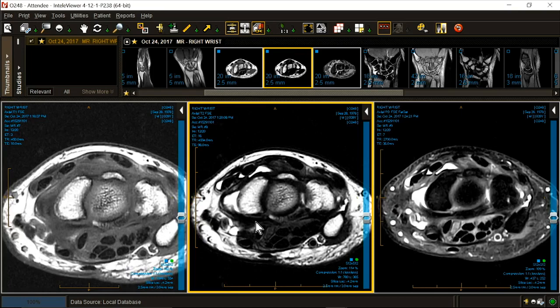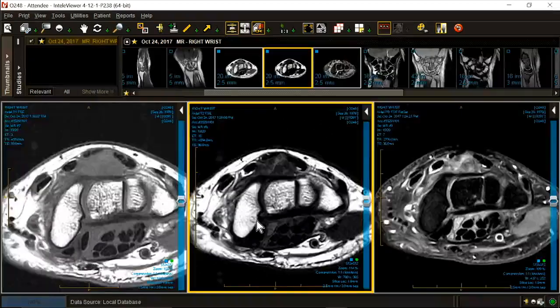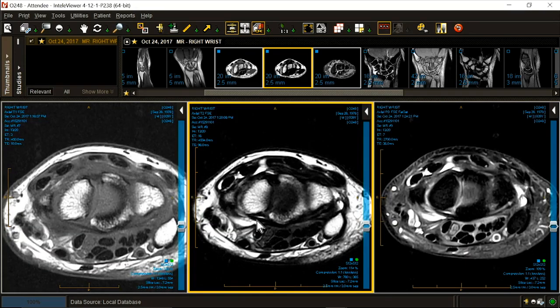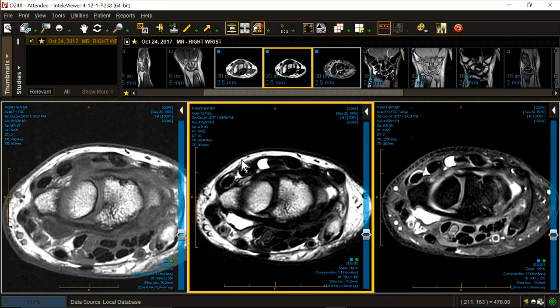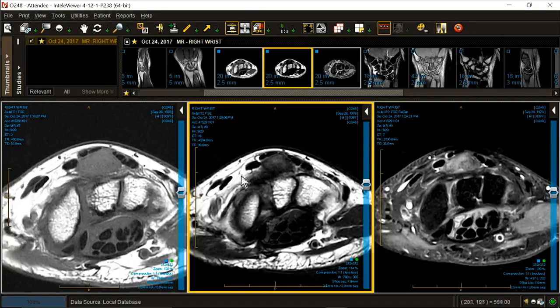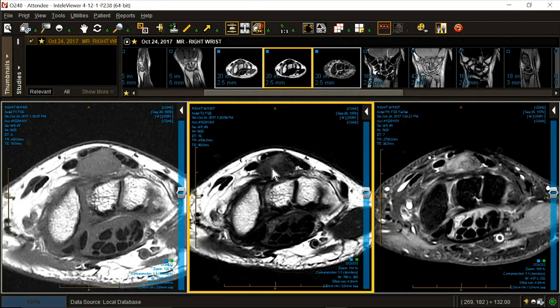That's not her problem. Yeah, they were worried about a ganglion. We found a couple of ganglia, big deal. We'll put it in the body of the report: incidentally noted, volar radial carpal ganglion, dorsal carpal ganglion in the typical locale. We will describe the extensive peritendinitis, no problem, going in the body of the report. But we have a dominant abnormality. That's going in the conclusion.